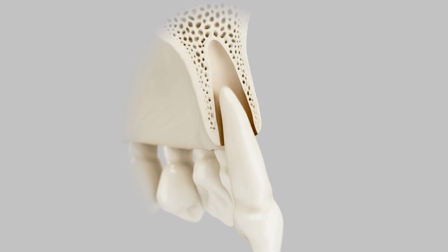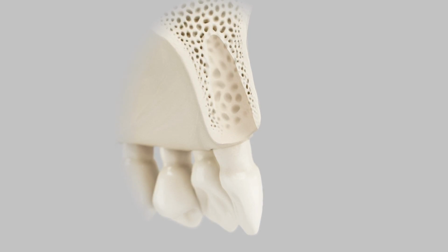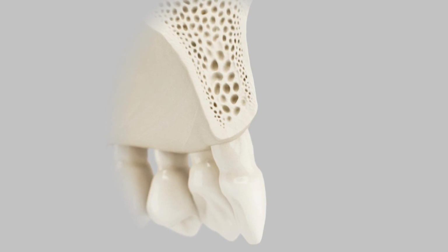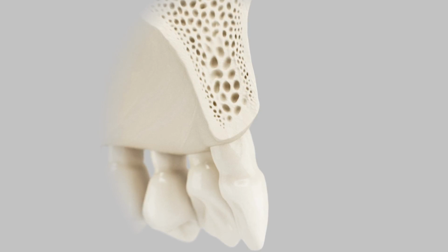After tooth loss or extraction, there is always some bone remodeling. Evidence shows that bone remodeling is more pronounced on the buccal than on the lingual side. This uneven bone remodeling results in a lingual-buccal sloped ridge.